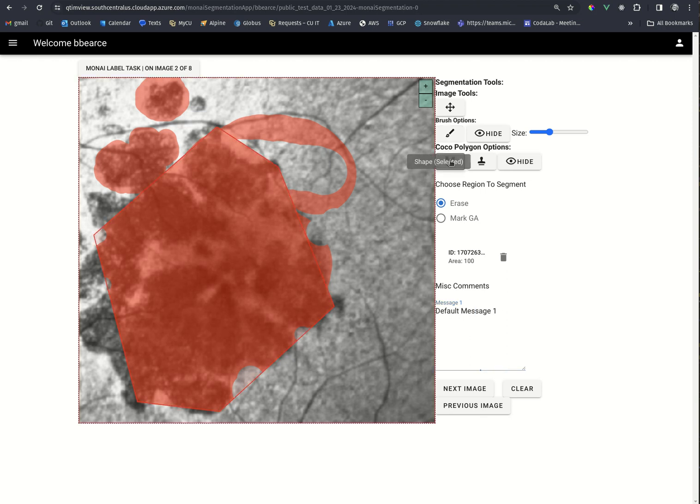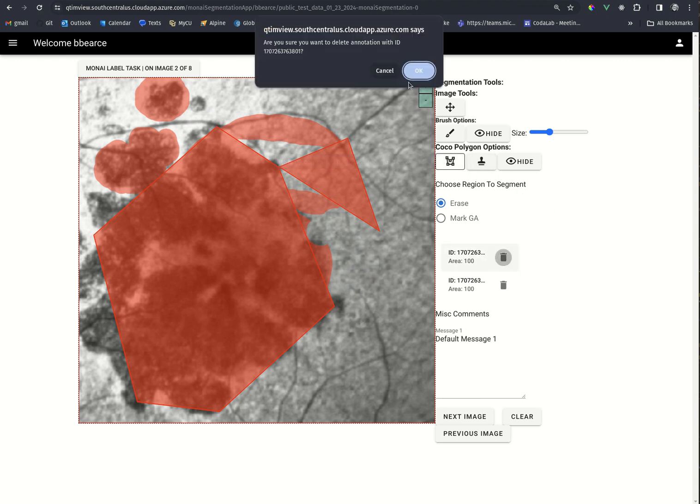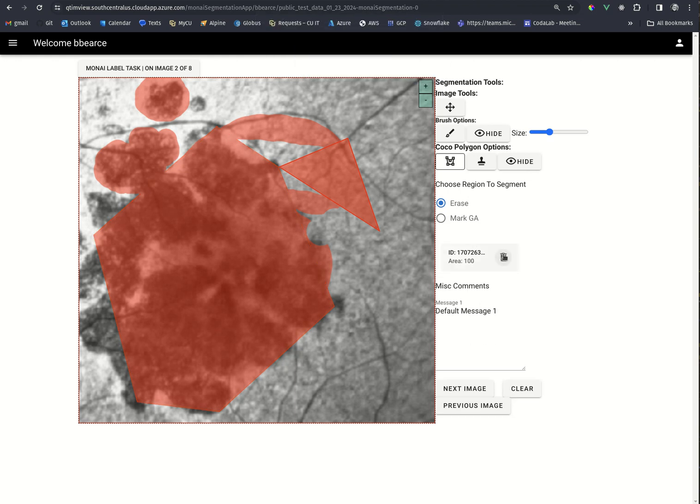And one more thing about the polygons. While they're still green and being decided upon, one can click the points and adjust, then lock it in and stamp as necessary. It's important to note that even if you delete polygons that have already been stamped, their brush pattern remains. Here we click next image to proceed to the next example.